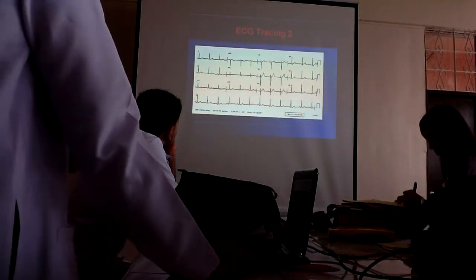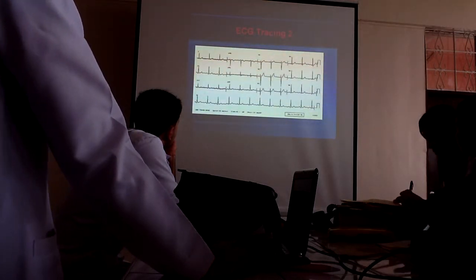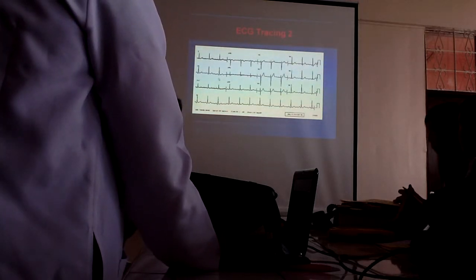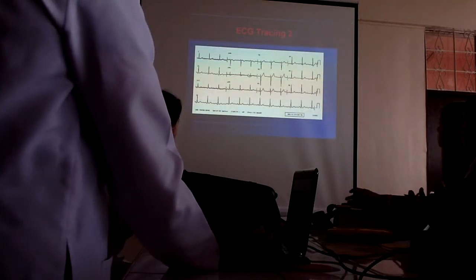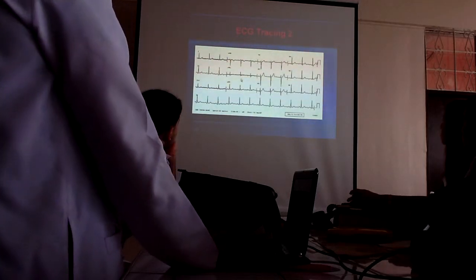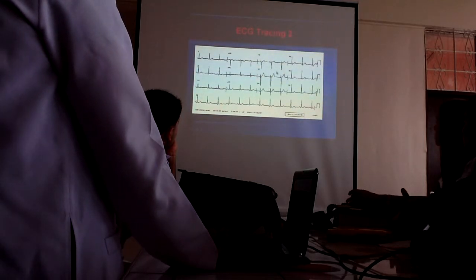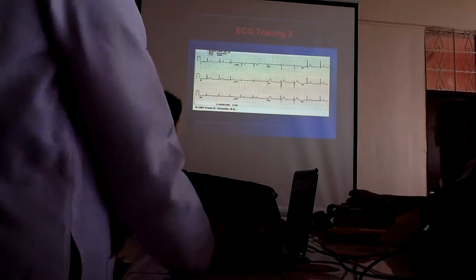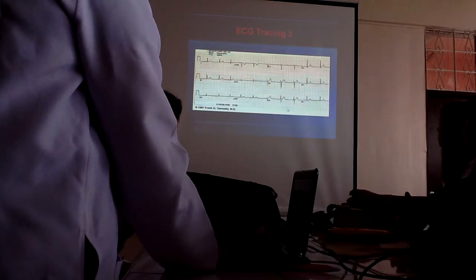Another ECG tracing. This is the normal ECG. Okay? So when you read an ECG, you look at if your P, QRS, T are present, if your rhythm is regular, your RR intervals are regular, you get the heart rate, you get the PR interval, the QRS, and the T and the QT interval. Okay? Inverted pa rin ang QRS. Next. Oh, this one is another example. So again, for this one, this is still within normal. As you go along, it becomes positive.